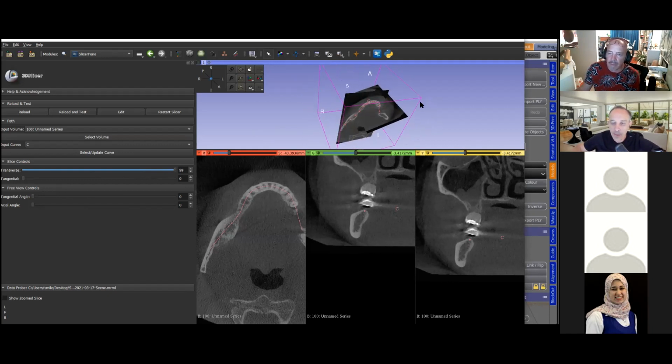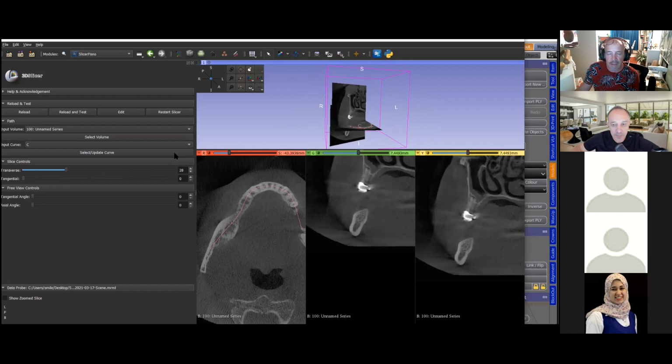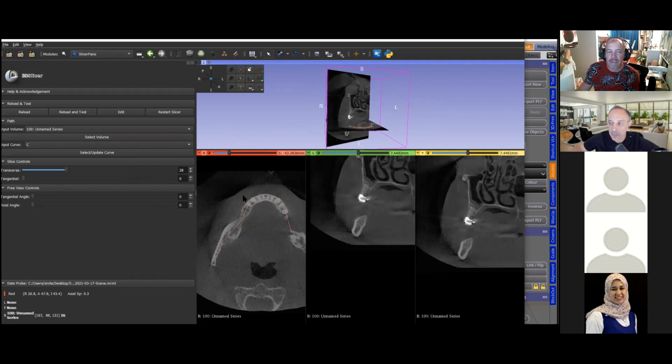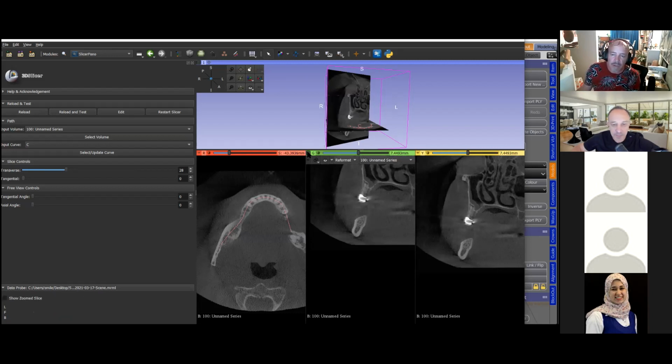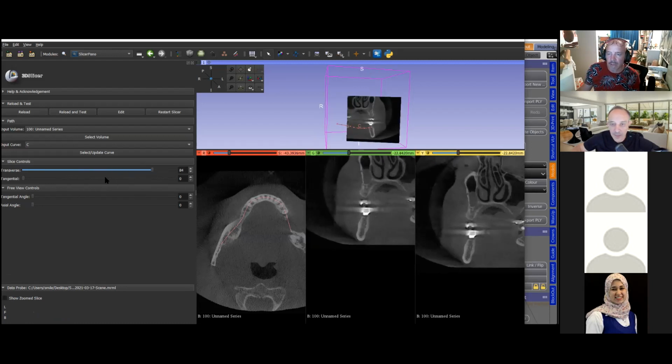All right, so what I'll do is I'll move back to where our implant site is. It's somewhere over here. But Wolfgang, I like working only with one slice sometimes, because I find three slices quite tricky to work with. So what I'm going to do is select the green slice over here. I'll hide everything except for the green slice, and this one I can then move around. See, so that's a single one.